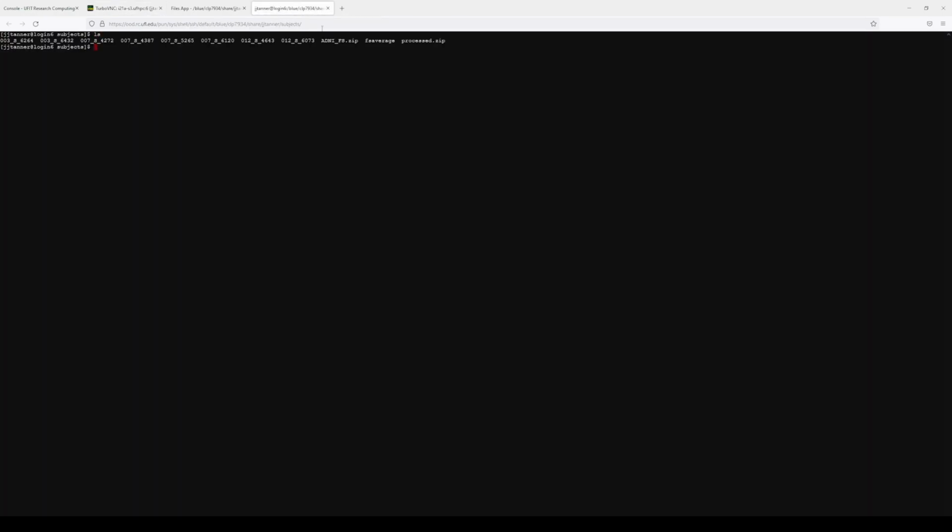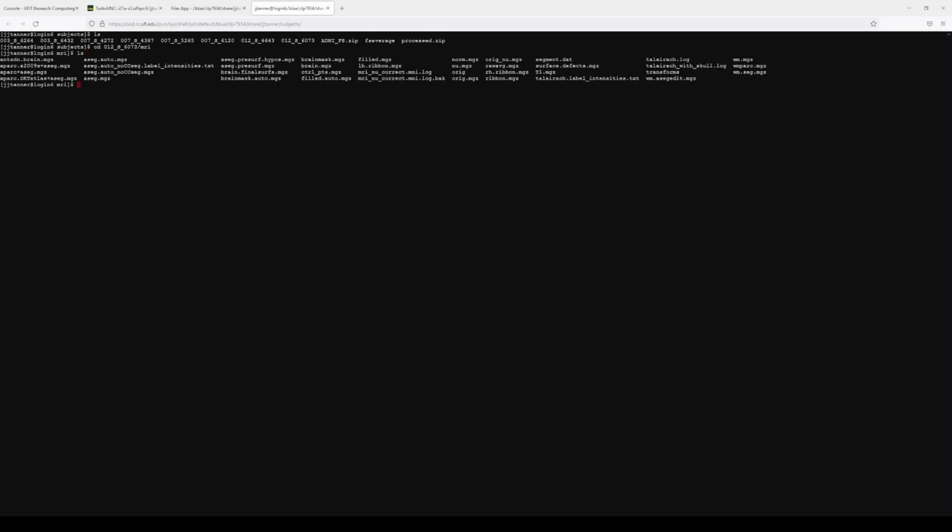So this was somebody who I was doing. So I'm going to CD into that directory. And then I can go into MRI and list the contents. Again, this is just being slow because of internet slowdowns. So the one I'm editing is this brain mask file, this .mgz. So one way to make a backup, I can just copy brainmask.mgz, and then maybe I could copy that up a couple of levels.